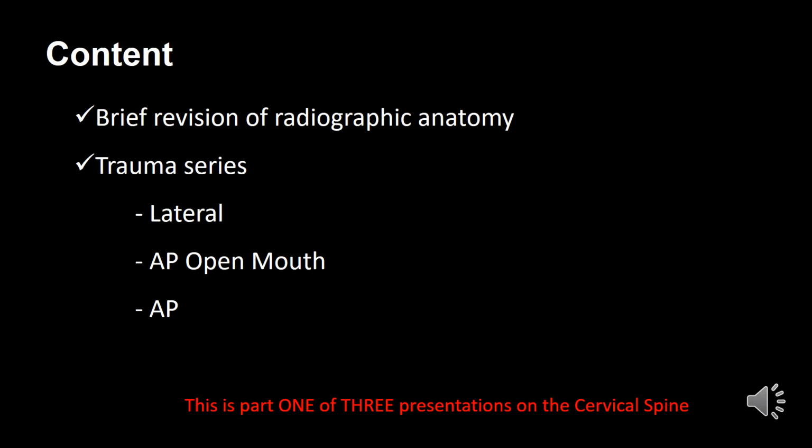Hello and welcome to part 1 of 3 presentations on the cervical spine. In this first presentation we will do a brief revision of the radiographic anatomy, and then we will focus on the trauma series for cervical spine, the lateral, the AP open mouth and the AP.